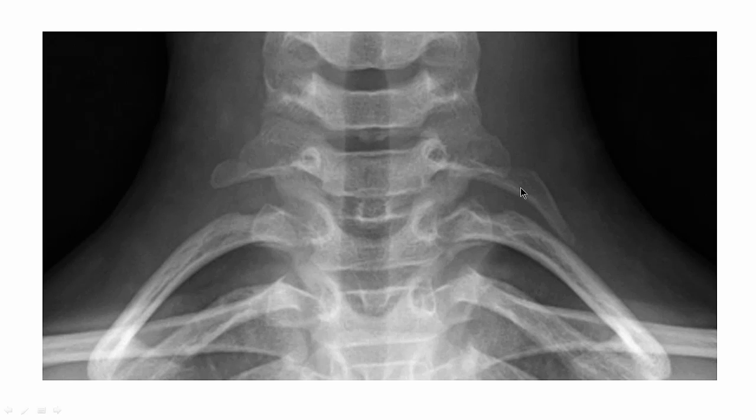That's a rudimentary rib. So these are called cervical ribs. Not only that, the patient has hypertrophic transverse processes. Here's this transverse process, pedicle of C7, spinous process, C7 is here, air shadow coming down, tracheal air shadow. Okay, but those are cervical ribs.